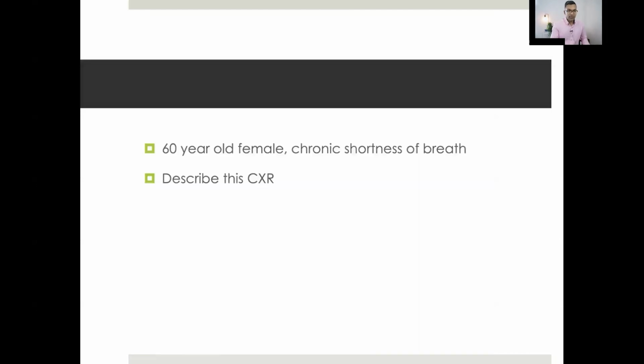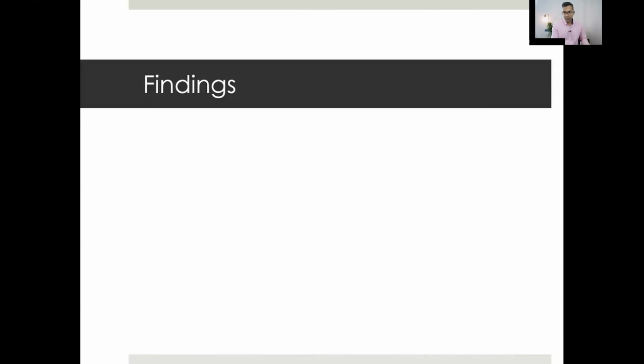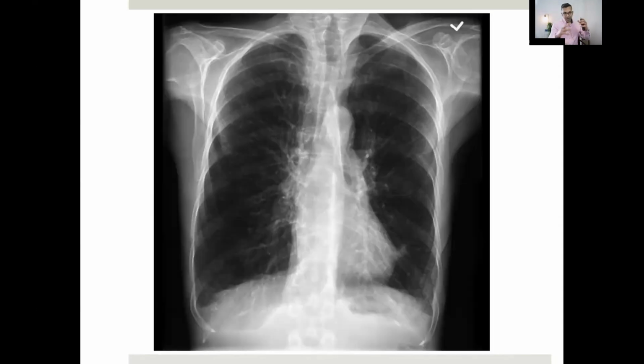What do you think this is? I think this could be a patient who has chronic airways disease, like emphysematous changes. Yeah, exacerbation of that. And so you told me hyperexpanded chest, there's hyperinflation, you've got flattening of the diaphragm, is all correct. So it really does look like just chronic airways disease and a lot of hyperinflation here. If at the worst end of this pathology, like say COPD, is there anything else complication-wise you might be able to see that's a relevant negative?